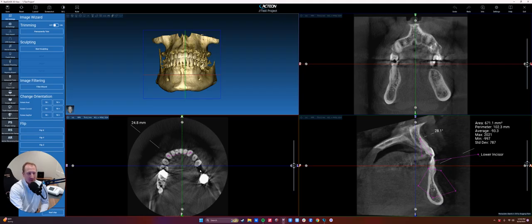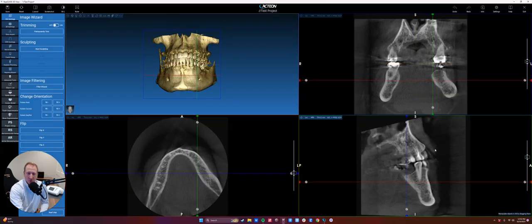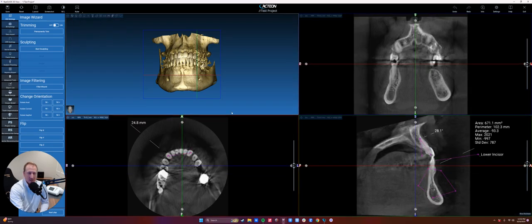That's nice, because as you move around in the CT, you see those go away because those are only made in one slice. So if I want to say, let's go back to that first distance, everything will snap back to exactly where it was when I did that distance, okay? And if we have too many like we do now, we can do clear all measurements. So get used to that ruler tool and that drop down. There's a lot of really helpful things in there, okay?